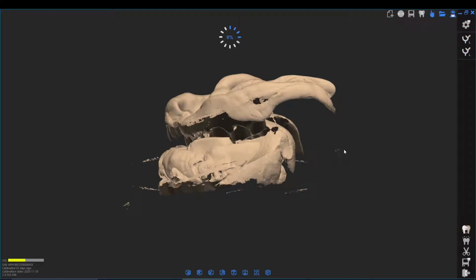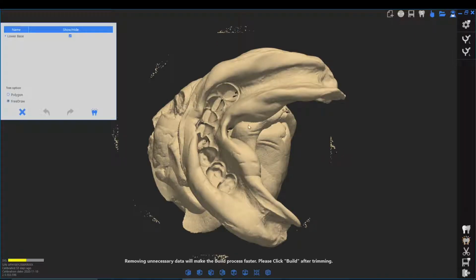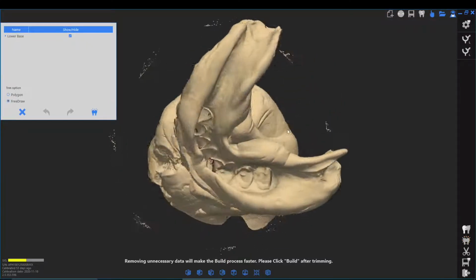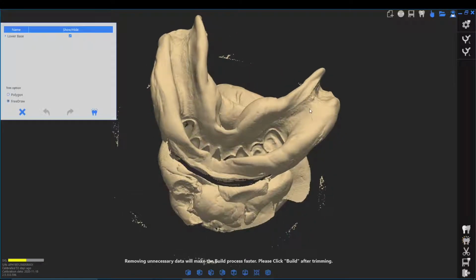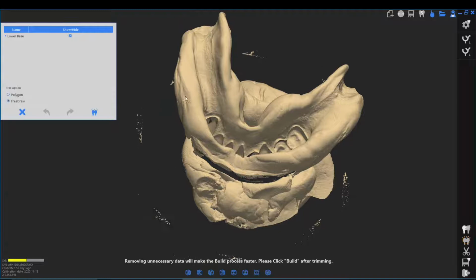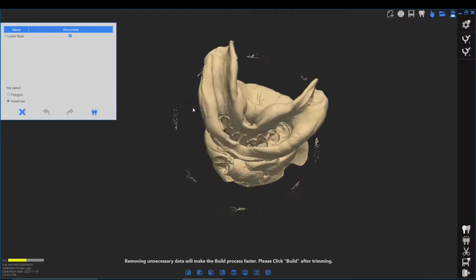So in the order form, I just chose pretty much anything. I chose missing tooth with no antagonist, chose an impression, full arch, and chose scan interproximals. So now it's showing me pretty much everything, and I have an option just to clean up my scans, which I'm going to do. So let's move this right here a little bit like this.